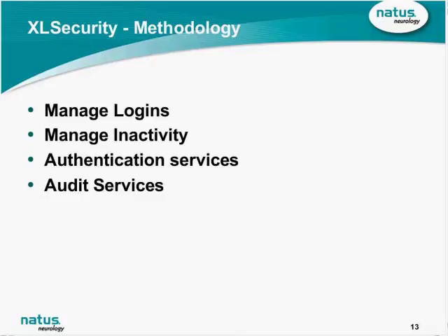It provides you with the ability to, first of all, create individual user logins. And by logins, all of you should be familiar with what a login is. That's basically you typing in a username and you have a password that is assigned to you or that you personally create.